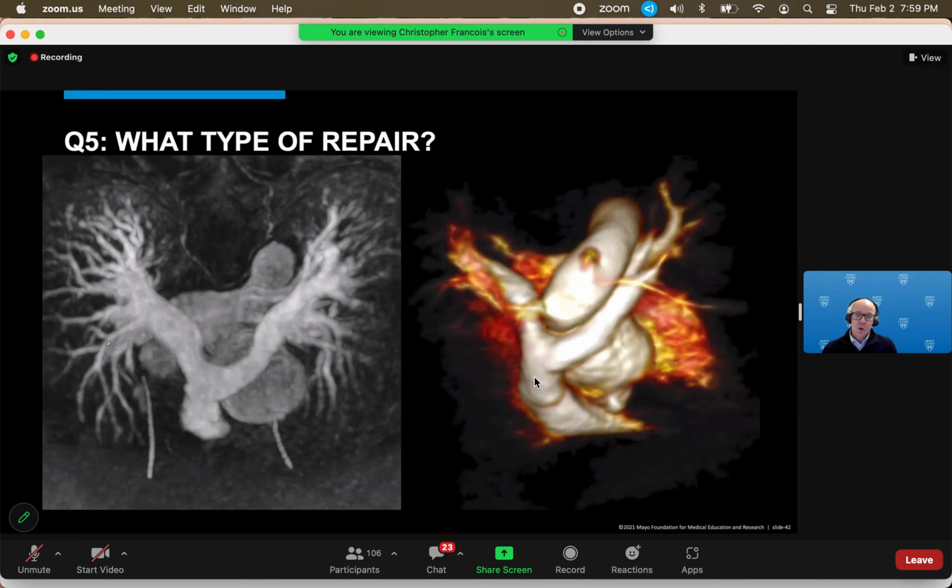All right. So last question related to surgical repairs. This can be for the next hot seat taker. This is not done for hypoplastic ventricle or single ventricle repair. This is a different kind of repair. And we're looking from the top down. Okay. What is going on here?